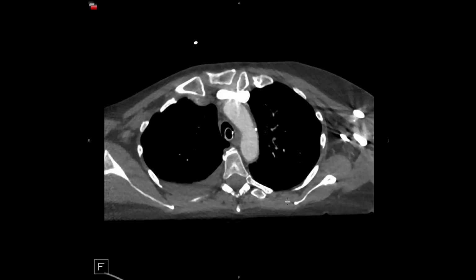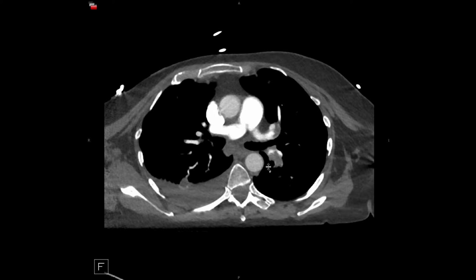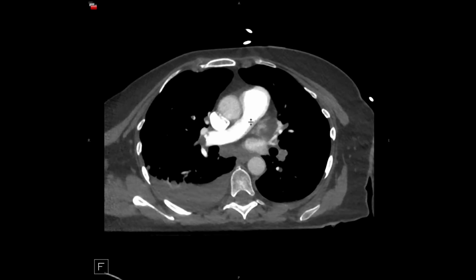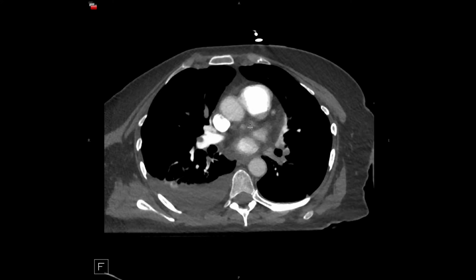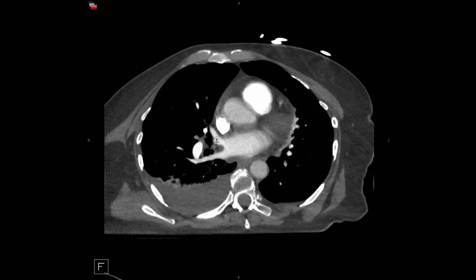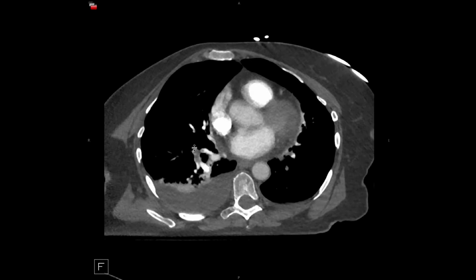Such as in this case here. So we can see this person has extensive pulmonary emboli. We've got multiple filling defects. They have rounded contours, are in general mostly centrally located within the pulmonary arteries. Here we can see this one has sort of plugged up this segmental artery in the right middle lobe. We have some more down here.